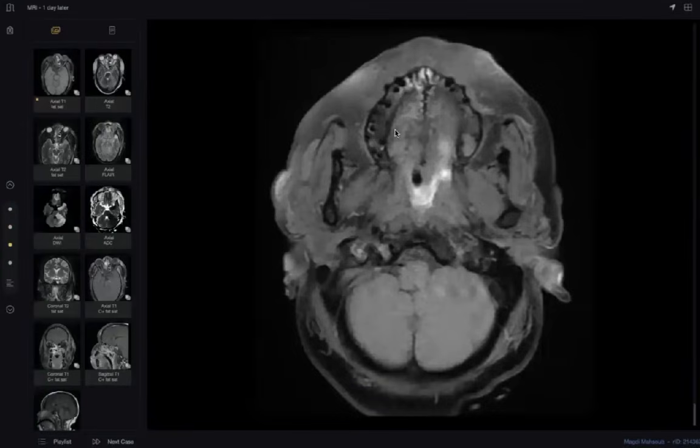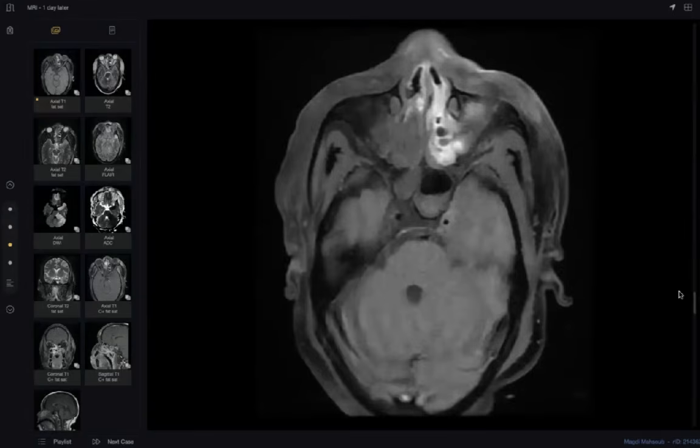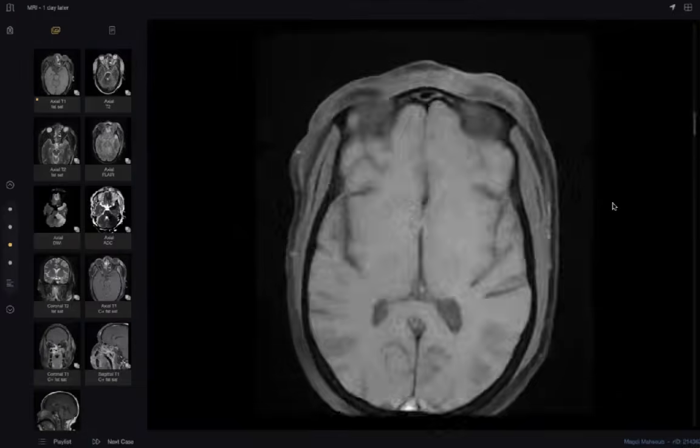Then the patient underwent MRI to delineate the whole disaster. What happened in MRI? This is T1 fat set. Hyperintensity within the sinuses on the left side, denoting high T1 signal. It means fungal sinusitis. Why? Because the hyphae in the sinus produce some heavy metal that produces this high T1 signal. So it is a very sure sign of fungal sinusitis.